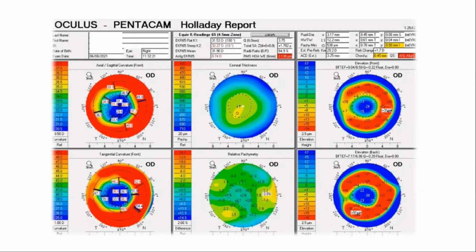Because traditionally we don't measure the posterior cornea, right? We mainly go by anterior corneal measurements, and we assume that the posterior cornea is healthy. I was wondering, for normal eyes, this one that you're showing is probably a post-LASIK eye, because it's flat in the center, right?